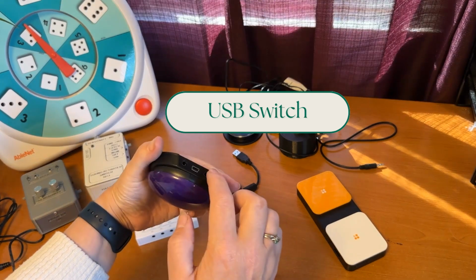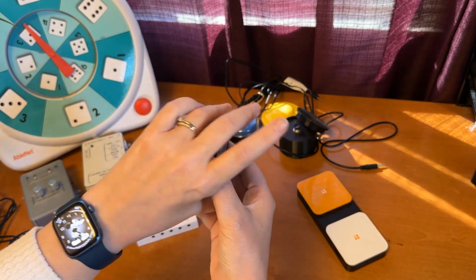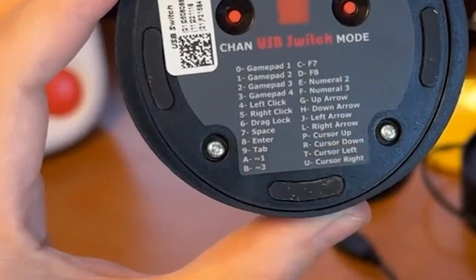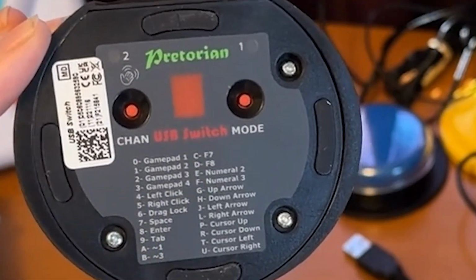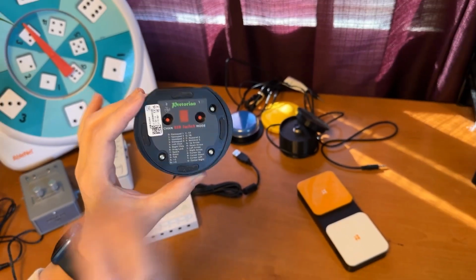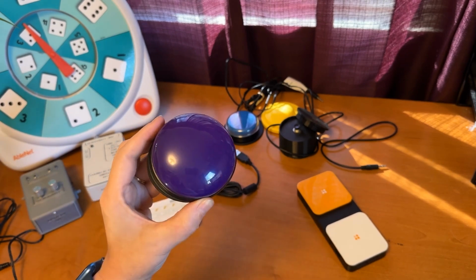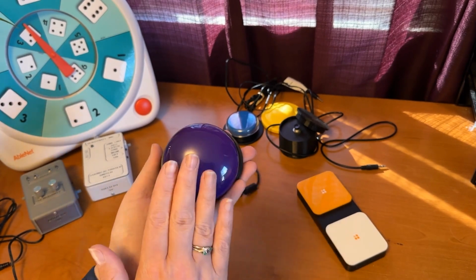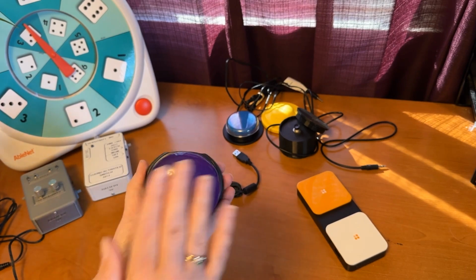So the back of this here plugs into the computer. And then if you look at the back here, I'll bring it up so you can see it. Here you can choose what this does. So you can change the channel and the mode. And this button can become a left click, a right click, an arrow, a space, an enter, any of those things by triggering this switch. So when this is plugged into a computer, you set these to whichever you want, and then when this is triggered, that becomes your enter or your down arrow, whatever you have it set for.